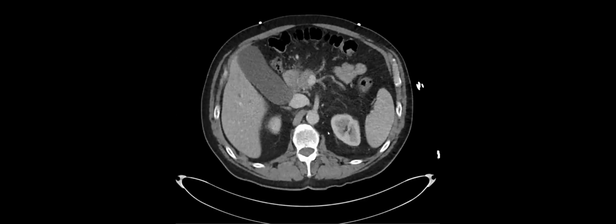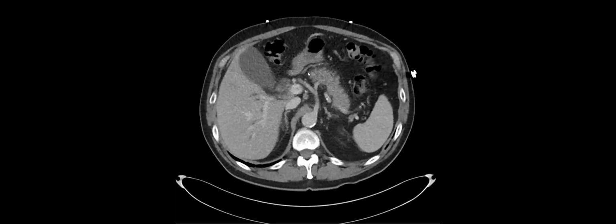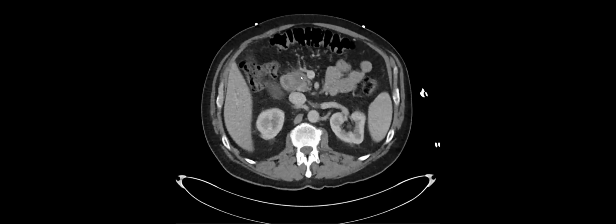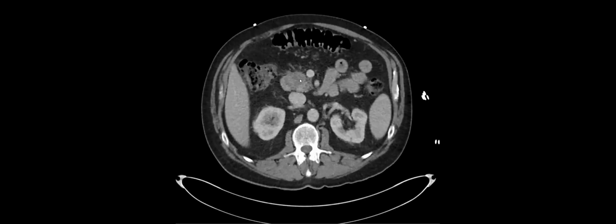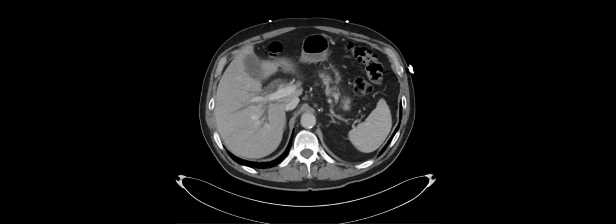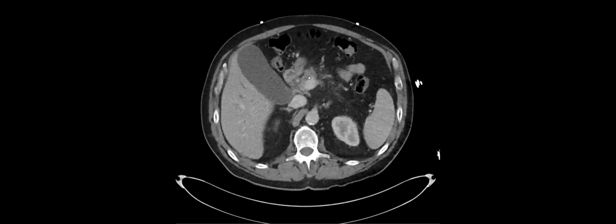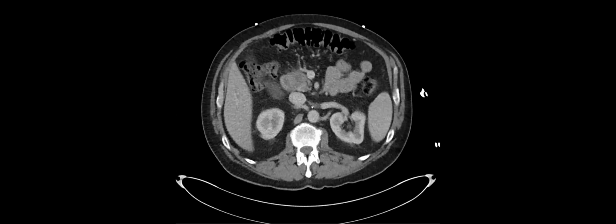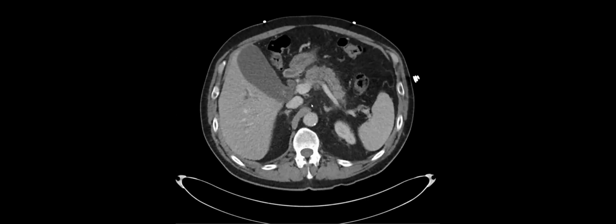Good. So that is kind of the point of this case that I wanted to point out. It's easy to see the pancreas, but don't forget, there's bile duct dilation here. And then there's actually this ill-defined, hypoenhancing mass here that ended up being biopsy-proven adeno. So my teaching point is don't just get excited about the pancreatitis, especially if there's a little bit of ductal prominence here, but you don't really have a good cause for it, there could be an underlying mass. And especially the clue here is that there's bile duct dilation.